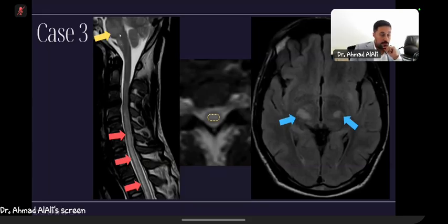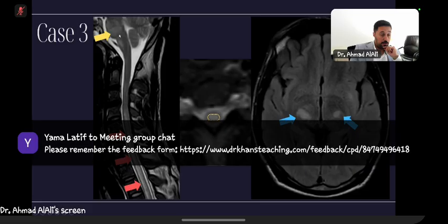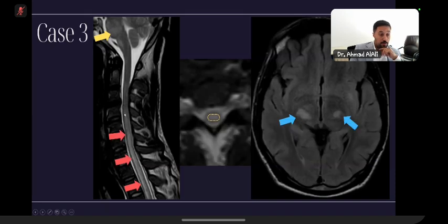There is hyperintense signal in the pons, medulla, and the cervical cord with extensive hyperintensity involving more than 3-4 segments, occupying more than two-thirds of the cord cross-sectional area in axial images, with involvement of thalami and gray matter, as you said. I will hold on that until candidate two participates with us. Candidate one, thank you for your effective participation.